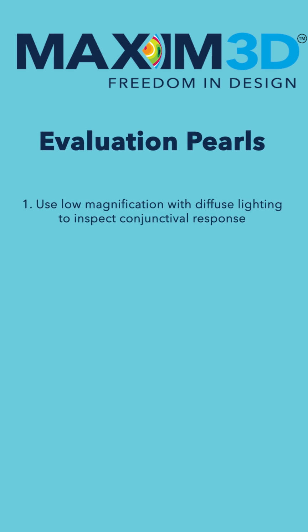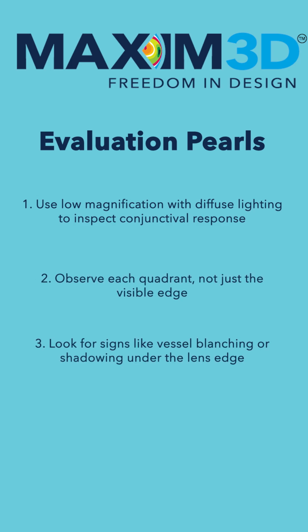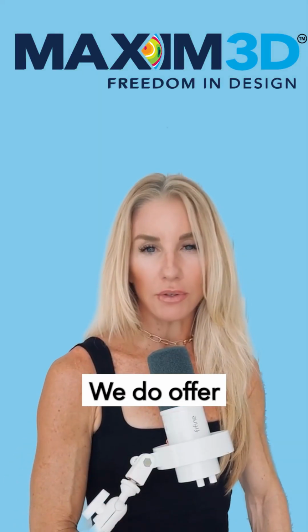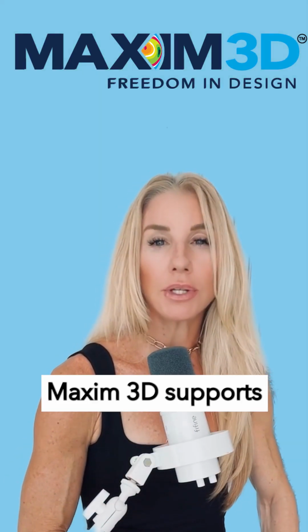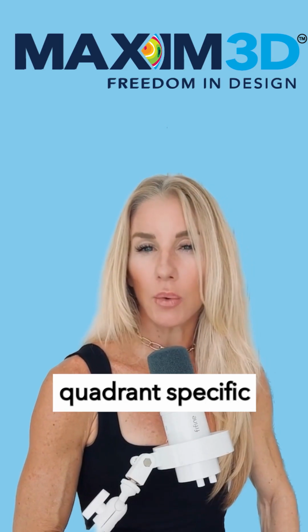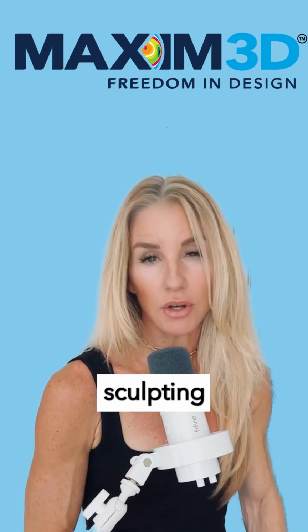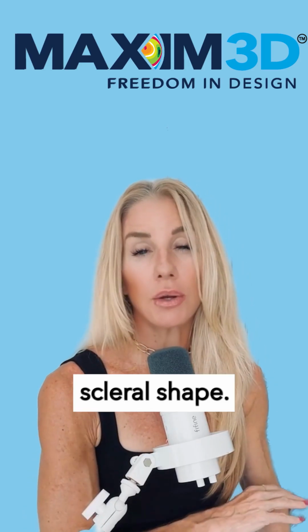Here are our evaluation pearls. Use low magnification with diffuse lighting to inspect conjunctival response. Observe each quadrant, not just the visible edge. Look for signs like vessel blanching or shadowing under the lens edge. We do offer some adjustment tools. Maxim 3D supports toric landings, quadrant-specific, and freeform haptics, enabling precise sculpting to match the eye's actual scleral shape.